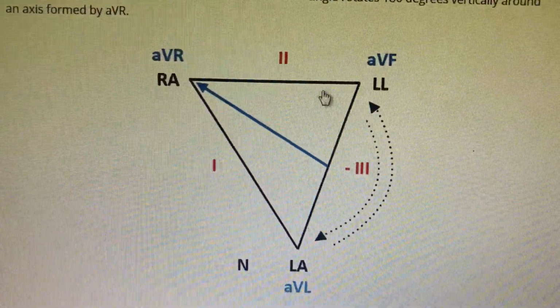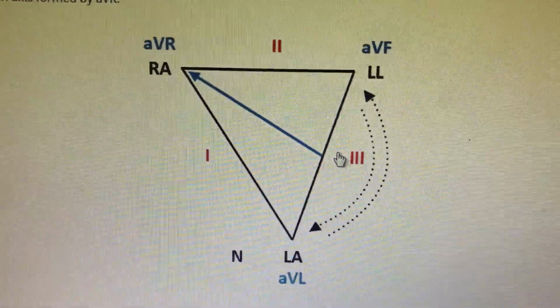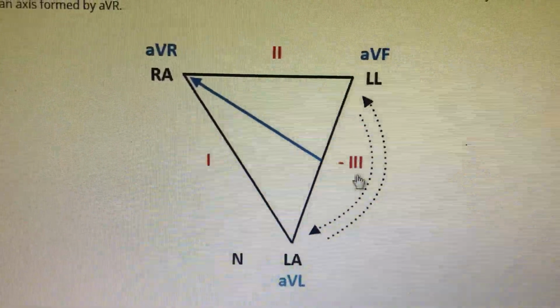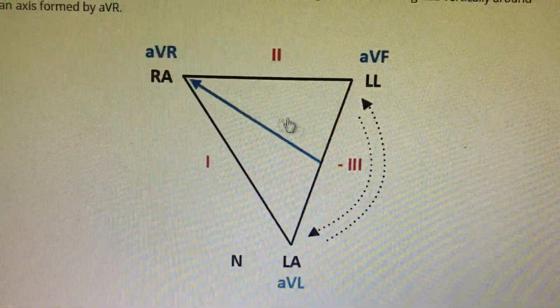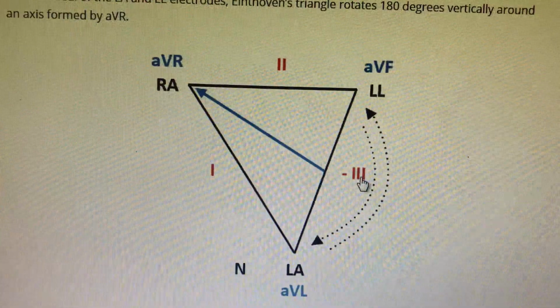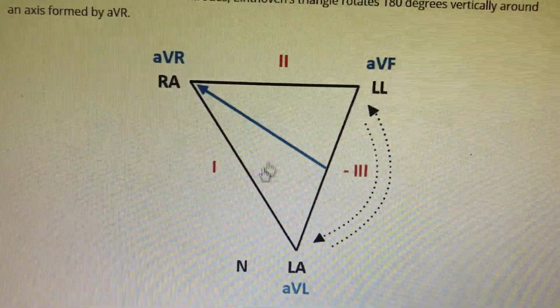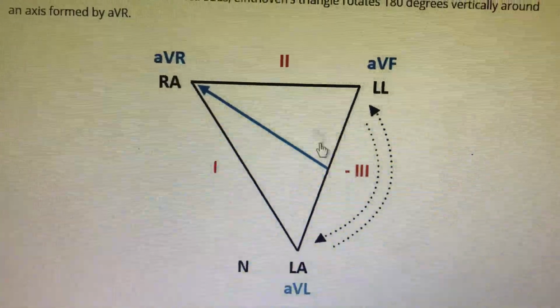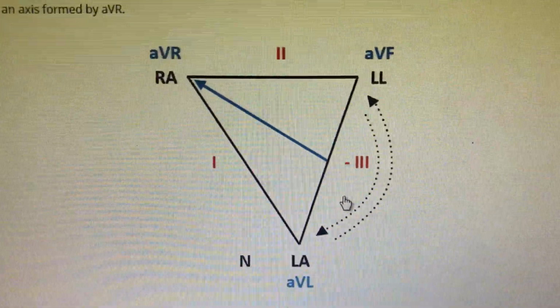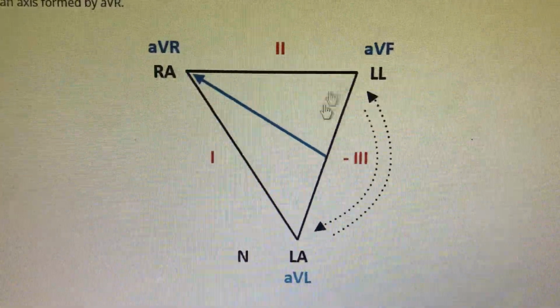So here the picture appears as if lead 2 has a somewhat lesser amplitude, lead 3 is absolutely inverted, and AVF is appearing like AVL. So it appears like inferior ischemia, and people feel that, okay, lead 3 is completely inverted, so it is most probably ischemia. Then you should look at lead 2, and then at lead 1, and figure it out, because it's very difficult to figure out, as other than lead 3 inversion there is no strong clue that there is a lead mismatch.